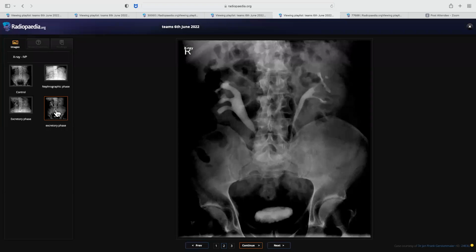Actually, both ureters are seen medially displaced and coursing towards the midline, with quite mild dilatation on the right side. So this could raise the possibility of retroperitoneal fibrosis, which encases both ureters and causes this mild right hydroureteronephrosis and upper hydroureter.